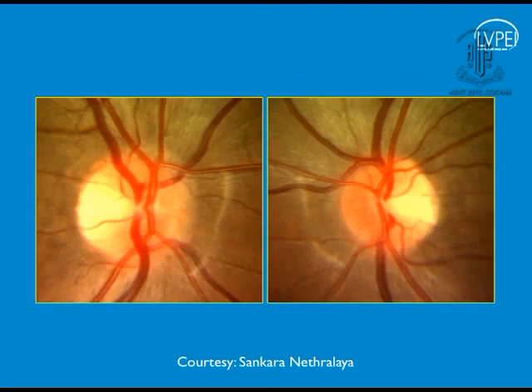Let us take some difficult examples now. Now you see this disc. Margin is clear, maybe slightly opaque here, but more or less we can make out the margin. The rim is okay. This is a photographic artifact. There was no pallor here. The rim was alright. And you look at the nerve fiber layer. The nerve fiber layer is elevated here. So this nerve fiber layer is prominent. But now the question is most crucial, whether it is transparent or opaque.